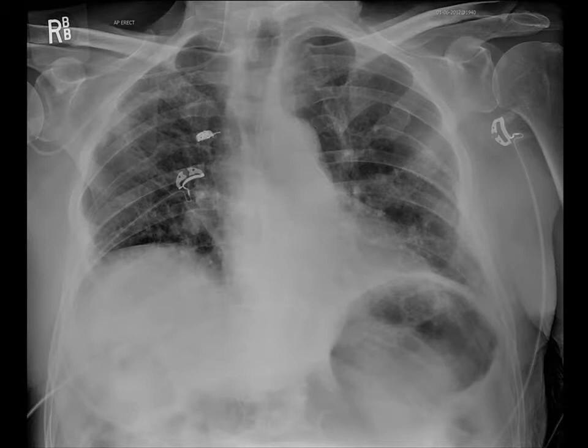So this patient was an 83-year-old male who was admitted for a GI bleed, and a right IJ was placed for transfusion. You can see what appears to be a right IJ catheter here, not following the course back to the heart, but instead seems to follow the venous system peripherally. So this catheter would have to be replaced.